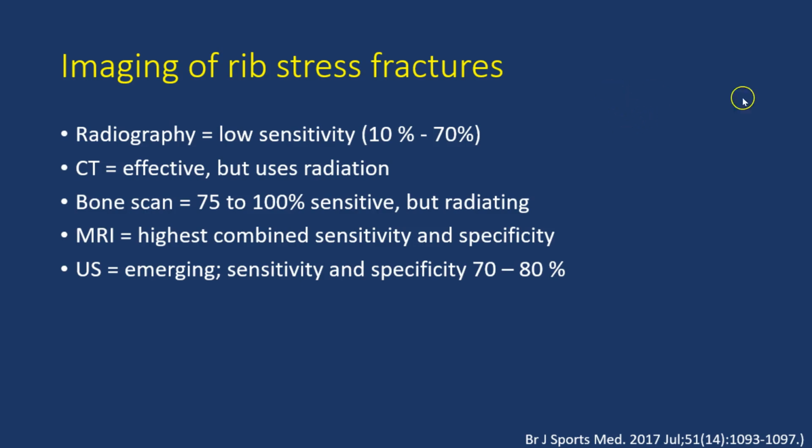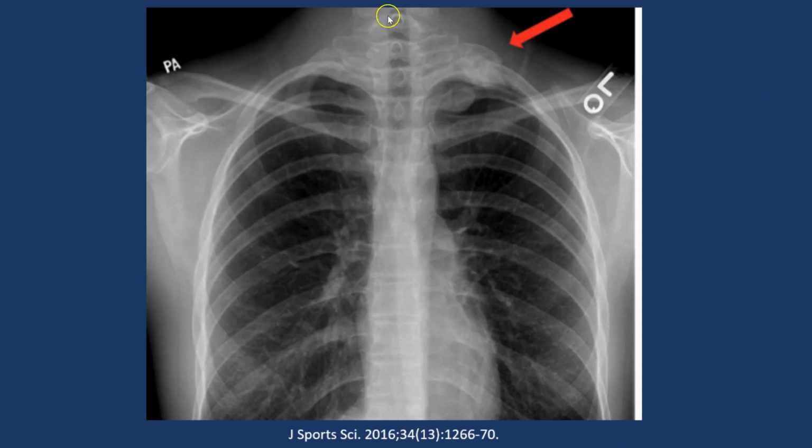All right, just to summarize what the patterns of stress fracture look like on these various imaging modalities. Here's a coned-in view of the thorax showing nicely stress fracture of the first rib, bony expansion, fracture line, and callus formation. It's important to note that for first rib stress fractures, these are common in throwing athletes, and cervical radiographs will be your best diagnostic test.